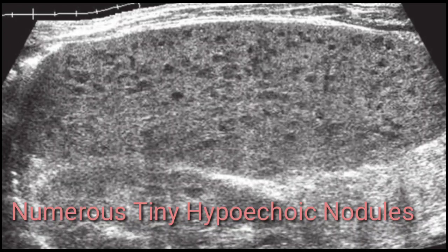This is miliary tuberculosis. Miliary tuberculosis will appear as such in the spleen. In the lung, on X-rays, it will appear as faint calcific foci, but in the spleen, under the ultrasound beam, it will appear as hypoechoic.